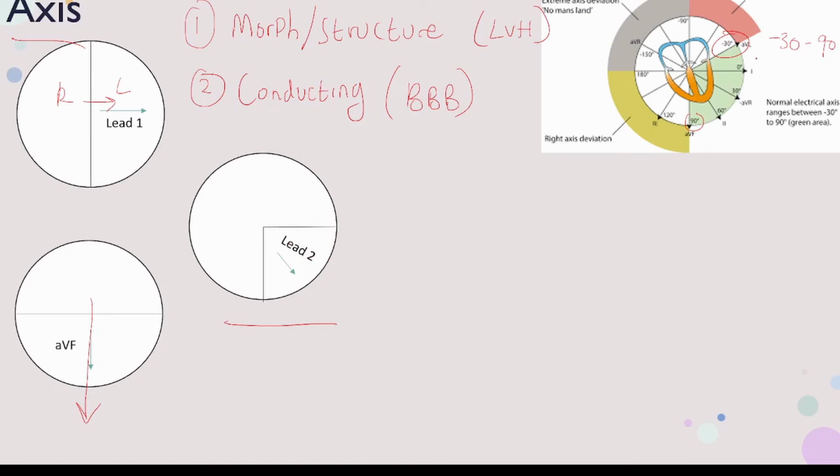Okay, as you can see here, lead 1 is here. This is lead 1, 0 degrees, and here is AVF. And as you can see, this area pretty much takes up most of the proportion of the normal axis. Now, you could make the argument that using AVL and AVF would be the best because it outlines the sort of extremes of the axis, which is true, and that's fair enough. Personally, for me, I just like lead 1 and AVF because it's just very simple.